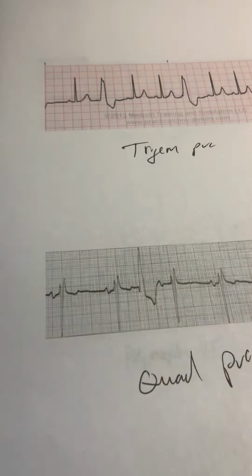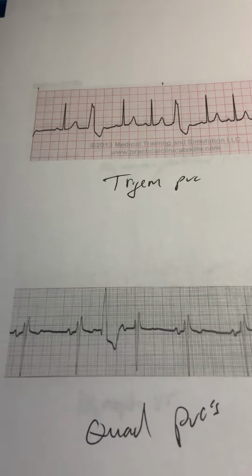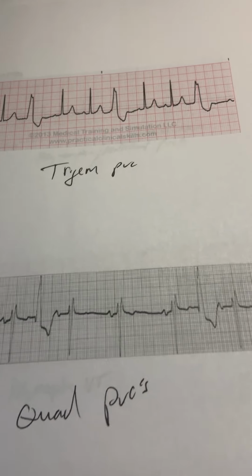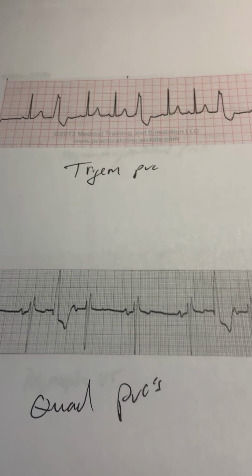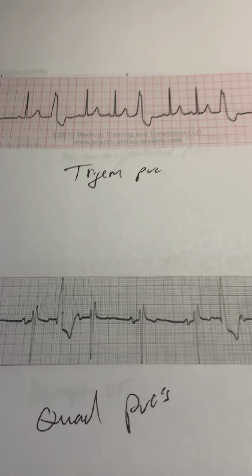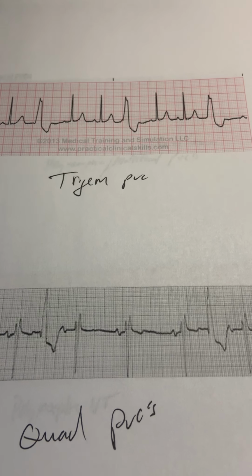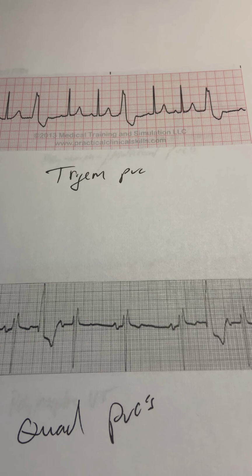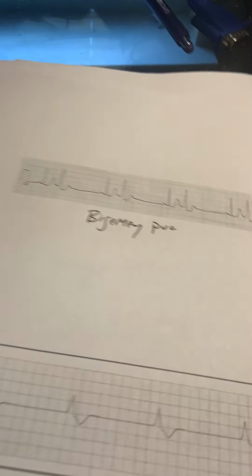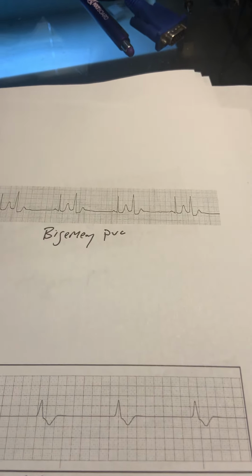A little bit of clinical correlation for that. Just for people that want to know, if you've got patients who are having these series of PVCs like this, trigeminy, quadrigeminy, bigeminy, it's important to try and correlate their perfusion. So if you look at this bigeminy strip up here, this is 6 seconds, so we can do 2, 4, 6, 8, so we can say that's 80.